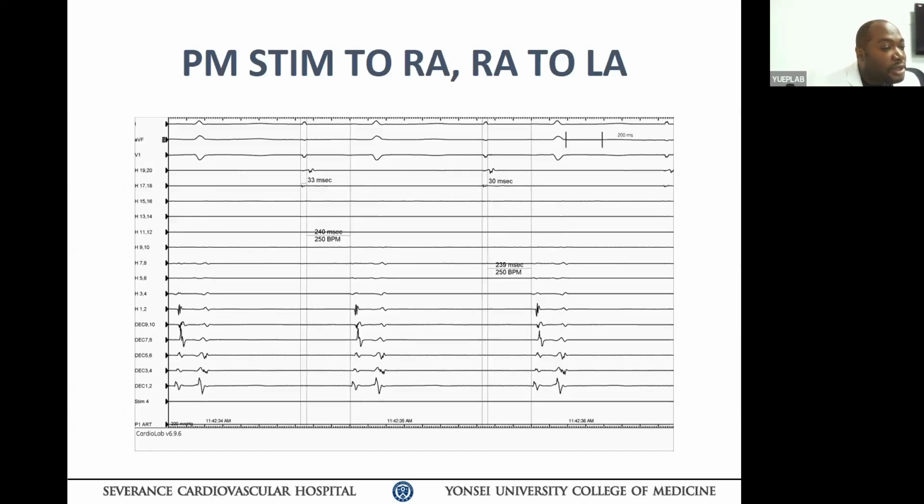During the ablation, after the ablation, we decided to assess the interatrial conduction. And here we have the spike. So this was pacing from the atrial lead of the pacemaker. And we see that from the stimulus to high RA, the earliest signal was 33 milliseconds after the stimulus.